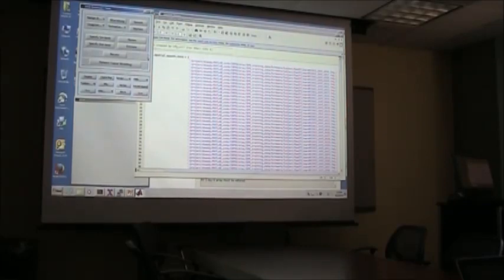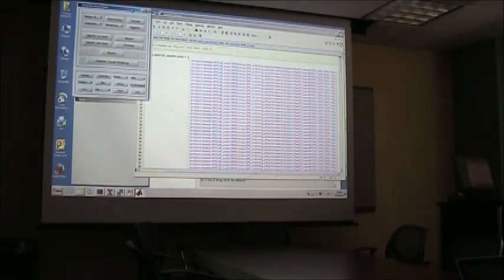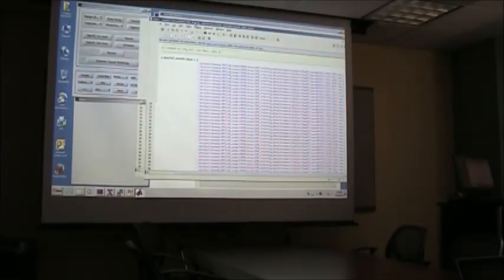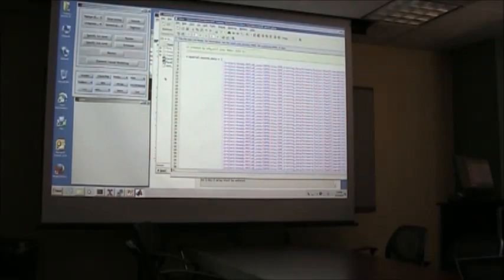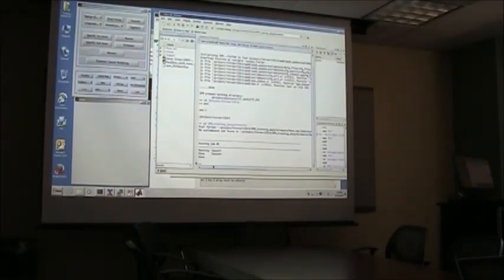Another important thing, which I didn't really mention last week, is that in the manual they go through each of these pre-processing steps one by one. They first do the realignment, save that, load up your data, save that job file, run it, then do the co-registration, same thing. What you can do is just add all this stuff together. And I can show an example from our own.